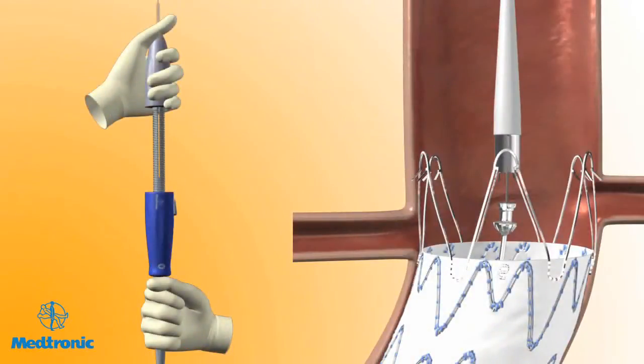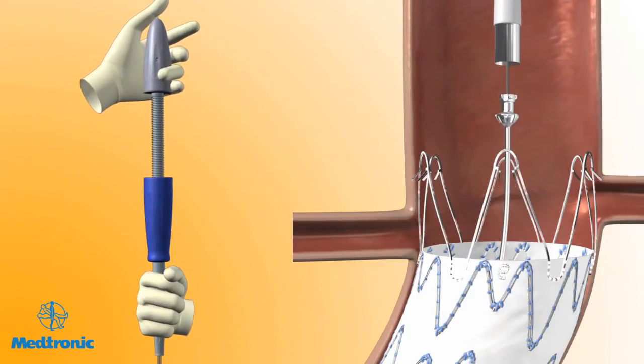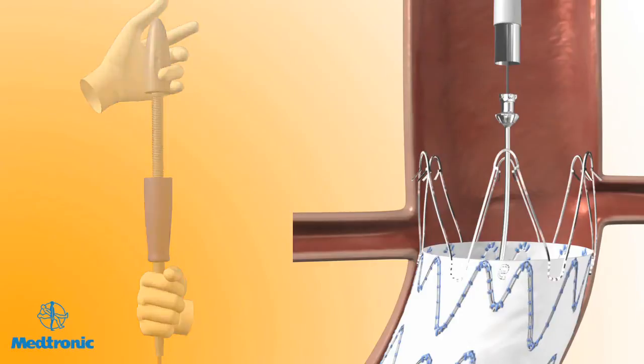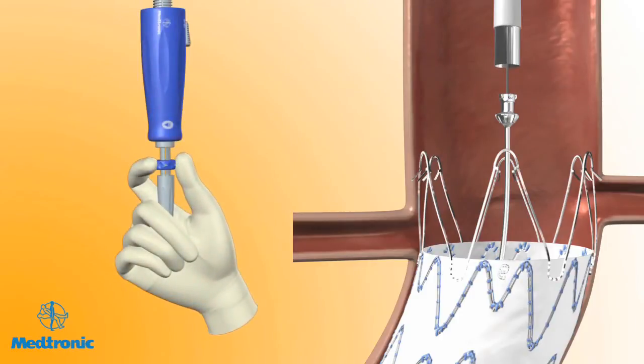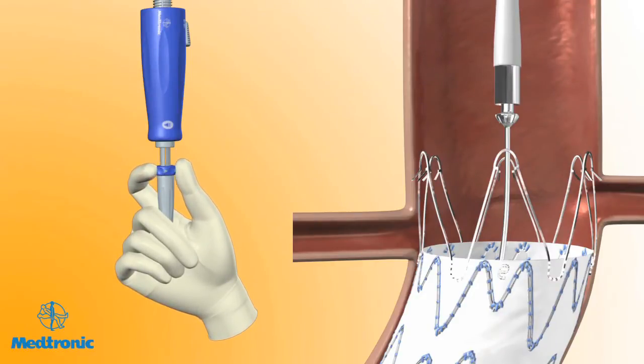The taper tip of the Endurant aortic delivery system needs to be recaptured before removing the delivery system. Gently torque and push the entire delivery system proximally approximately 3 centimeters so that the taper tip and spindle are completely clear of the suprarenal stent. Then, rotate the back end wheel counterclockwise in the opposite direction of the arrows until the spindle has been completely recaptured in the taper tip and the back end wheel has been returned to the bottom of the back end screw gear.